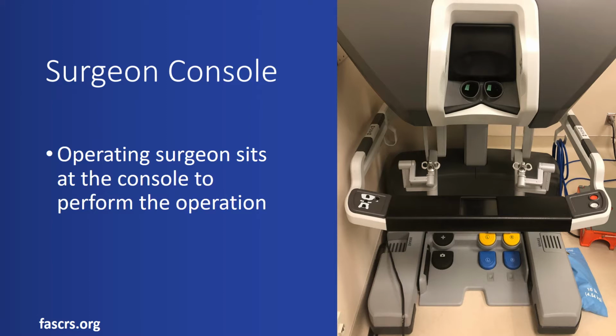The operating surgeon sits at the surgeon console to control the robot during the operation. The surgeon rests their head in the viewfinder in the middle of the console, which provides the surgeon with a binocular view. Within the headrest, there is a microphone and a speaker, which are connected to the patient cart to allow for easier communication with the rest of the surgical team.